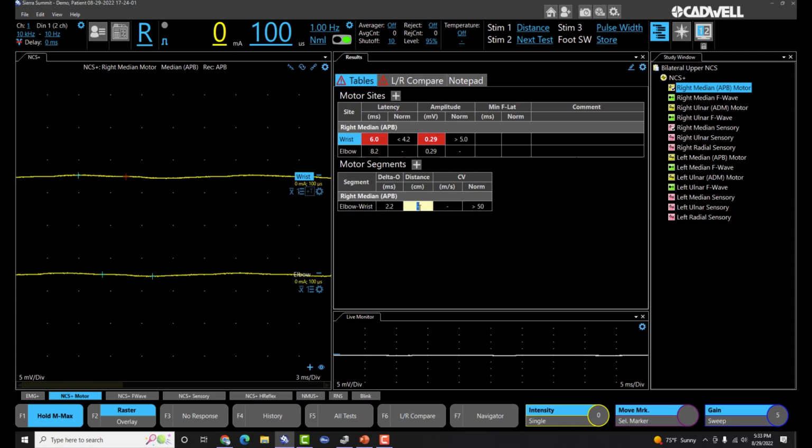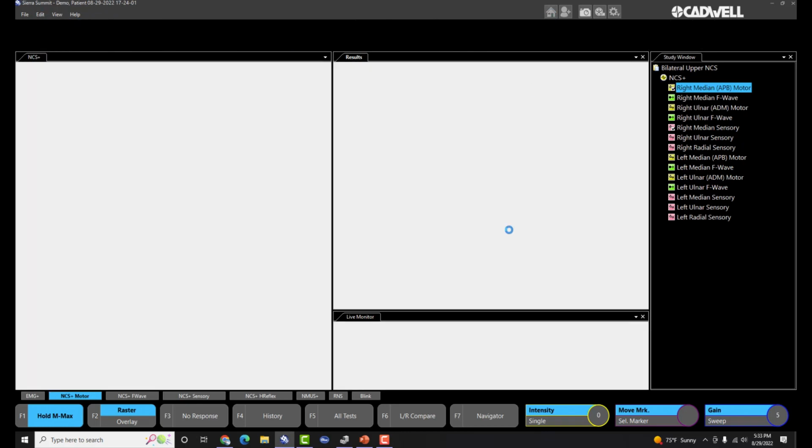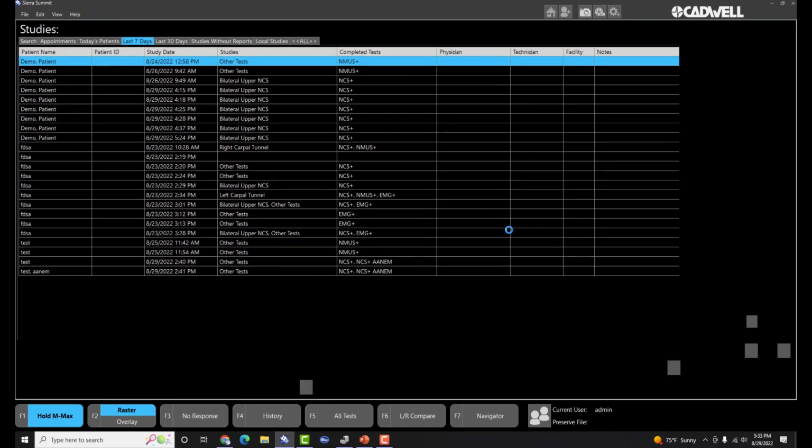You can type in a default distance if you want one. That would just start the distance at that point. So just type in any distance that you want and use edit save test parameters, and then you can have default distances show up that way as well. And finally, just a reminder, when you've made the changes that you want to make, to keep those changes as default, always go to edit save test parameters and then go back to your home screen.